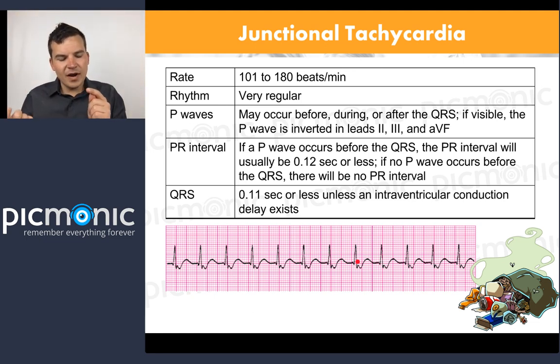If you identify the QRS, then you know that the P should be right before it and the T should be after it, right? Sometimes it requires a little bit of guesswork, but you end up getting the hang of it. There should be a P wave right here causing this. So there's the QRS, and then remember, coming back above the isoelectric line, T. Here's our T wave. So this is just a PQRST. This is actually a hidden P wave down here at the same time as the S.